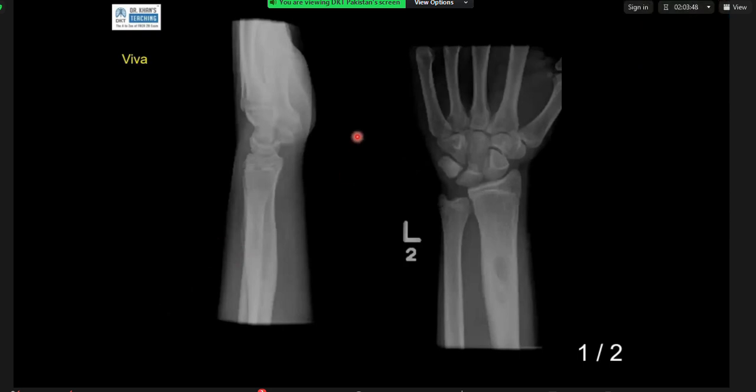So, lateral and frontal radiograph of the left forearm and wrist joint of a skeletally immature patient. There is an ill-defined oval-shaped lucency seen at the distal diaphysis of the left radius bone with surrounding sclerosis. There is also some surrounding soft tissue distension seen on the lateral view. So appearances are those of an aggressive lesion. My differential diagnosis would include infection, maybe Langerhans cell histiocytosis, or even Ewing's sarcoma, considering the patient's young age.